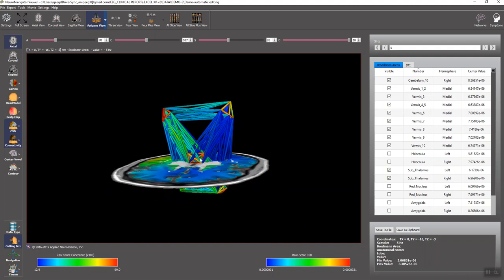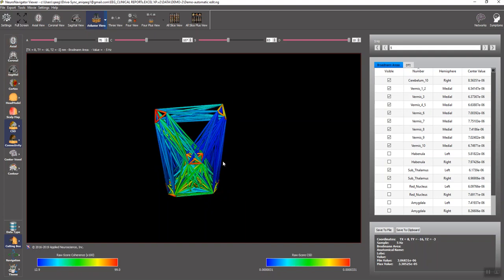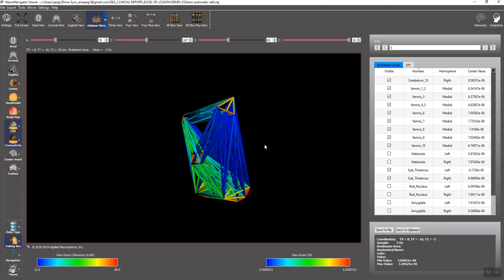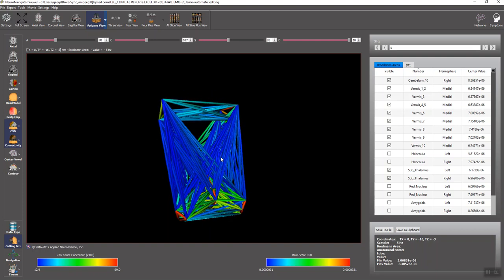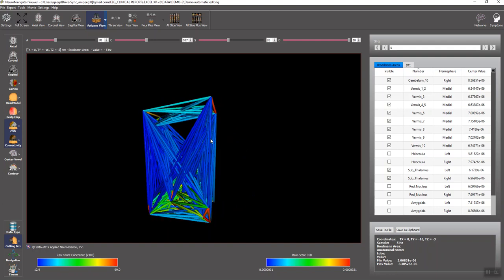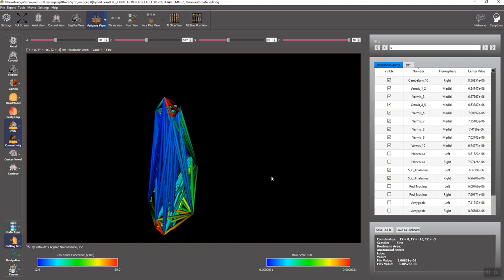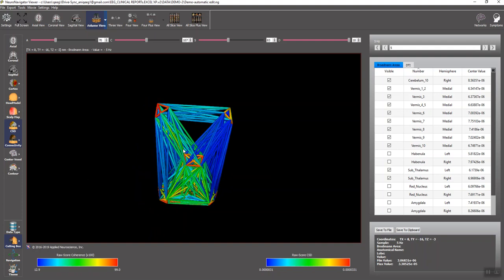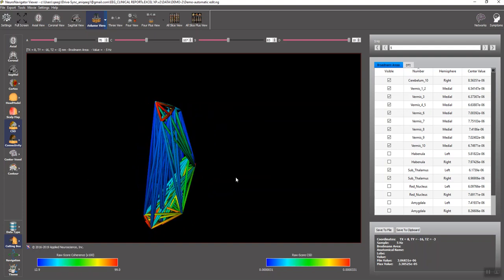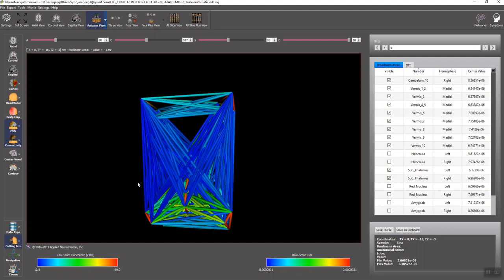Now, this is the thalamus. And so you can see, and I'm going to get rid of the axial slice here, you can see the hub of the thalamus connecting to the motor cortex bilaterally. There's not a lot of communication interhemispherically, but there is fairly high communication locally in the sensory-motor cortex. There's also a fair amount of communication in the cerebellum and certainly in the thalamus.